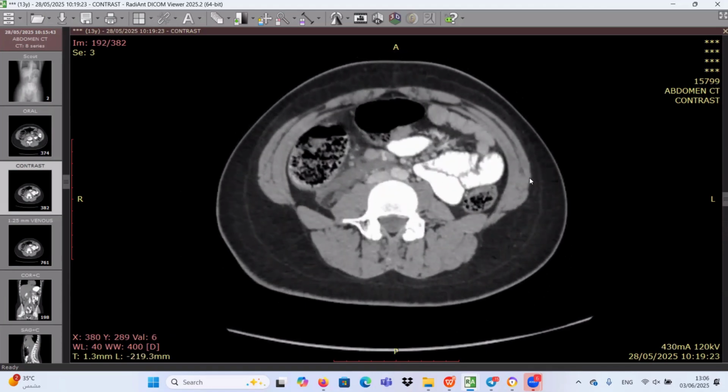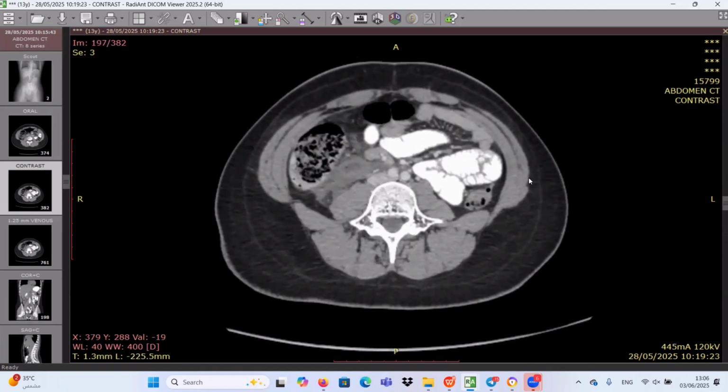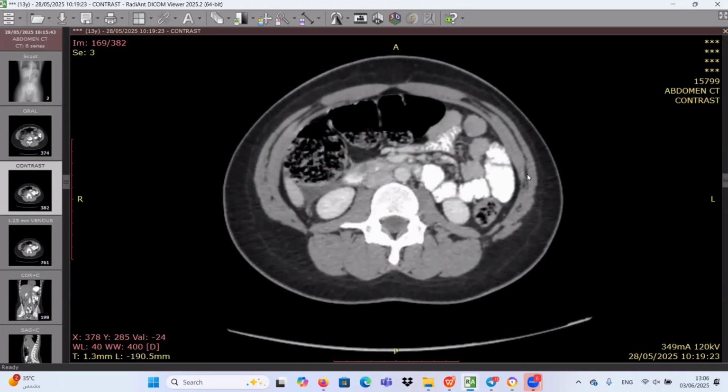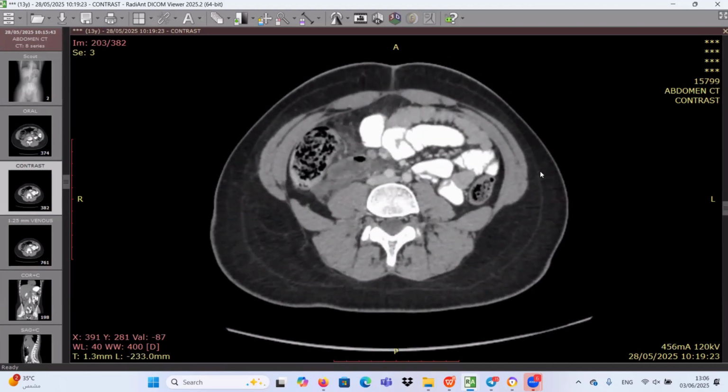There appears to be none. I think also we have a few mesenteric lymph nodes. I mentioned those. Yes, you mentioned. So I think you collected the most important findings. We have a tubular structure, and if you measure this tubular structure, I think it is more than about 2 centimeters.